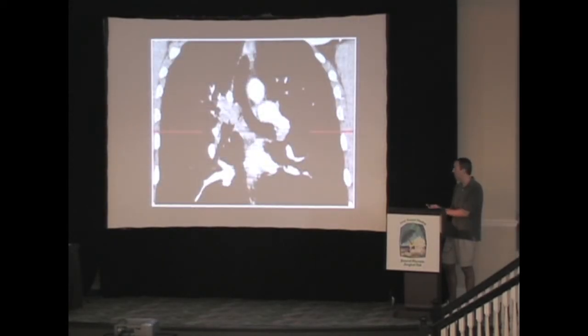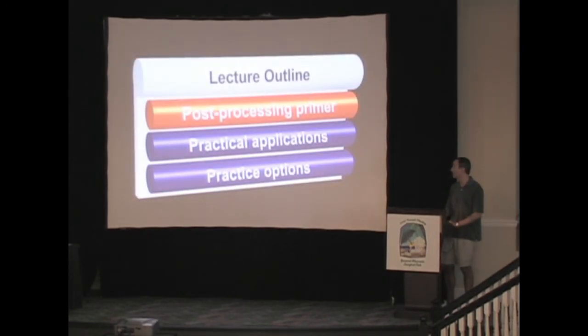This is a case of a patient with an adenoid cystic carcinoma of the carina extending into the right upper lobe bronchus and with an extratracheal extension. And I can remember reviewing this case with one of our thoracic surgeons, Simone Shiku, who used to be at my institution. I remember we went through the axial images, and he was very quiet. And then when we pulled up this multiplanar image, all of a sudden it was as though a light went off. He knew exactly how he was going to do the procedure, and it became very clear to me as he articulated it how helpful these types of images are for him as a surgeon, and how much easier it is to do his planning with these than with the axial images.